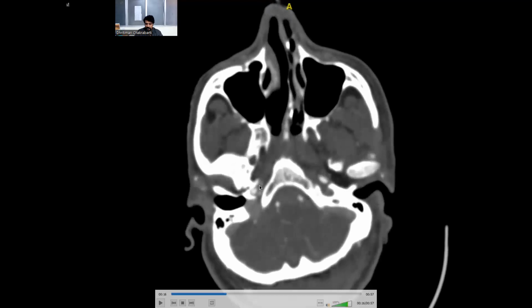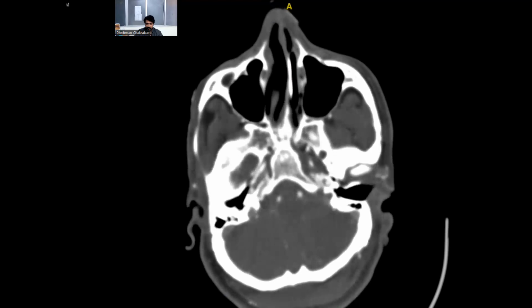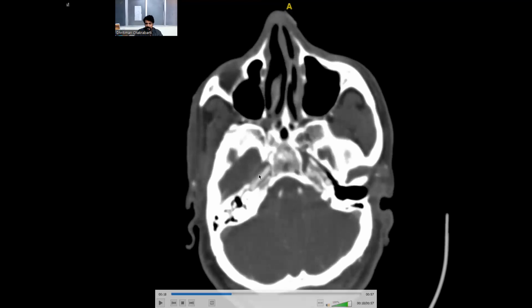Okay, so are you able to see it enter the temporal bone? After this, it will make a loop like this. Okay, so it will just keep watching. Are you able to see it became parallel to the skull base? So this is the petrous part of the ICA.